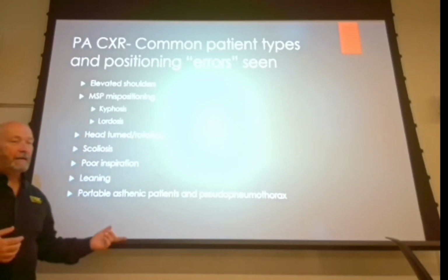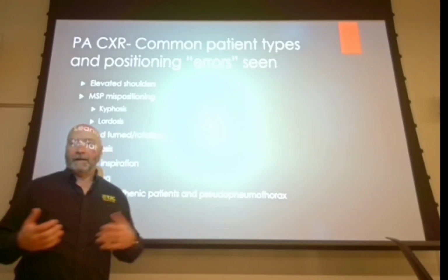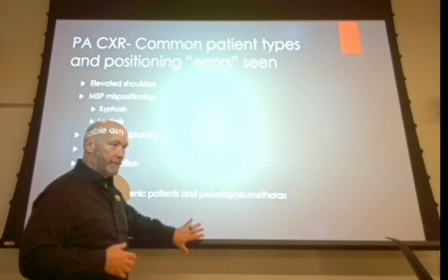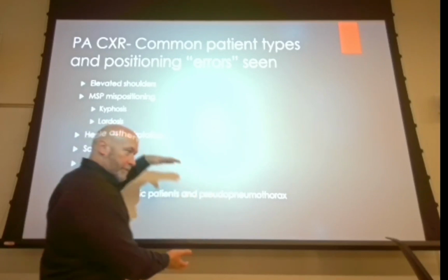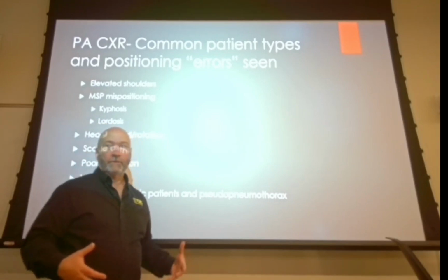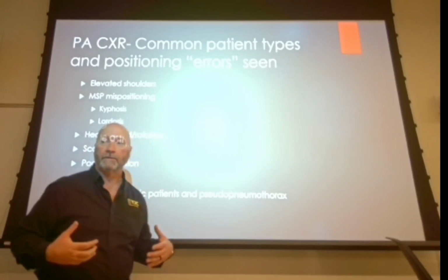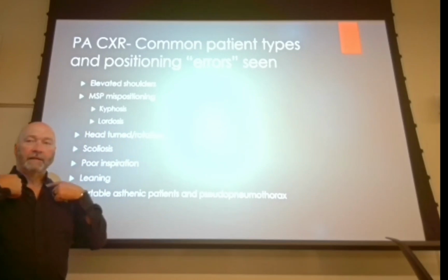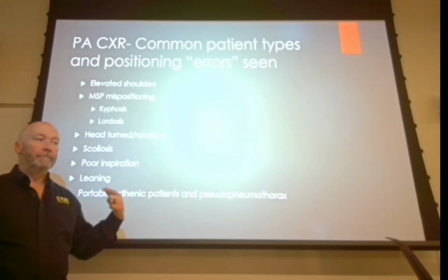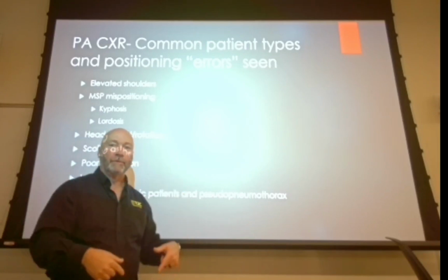Also, what we might get with kyphosis is not truly kyphosis. If you've got a patient that's got a belly and you tell them, I want you to put your chest all the way up against this board, and they've really got a great big belly, they'll do that, but the belly's going to hit first, and that's going to cause them to lean forward into it. What that's going to do is take the clavicles and lower them in the chest. So it may give us also a little bit of a V shape, but it's going to put the clavicles further down in the chest.